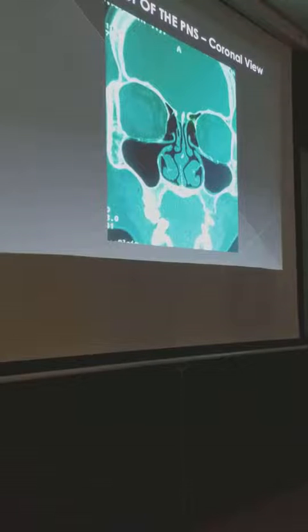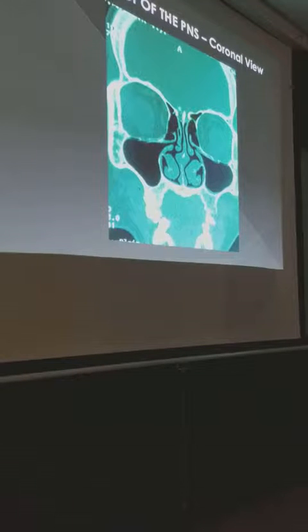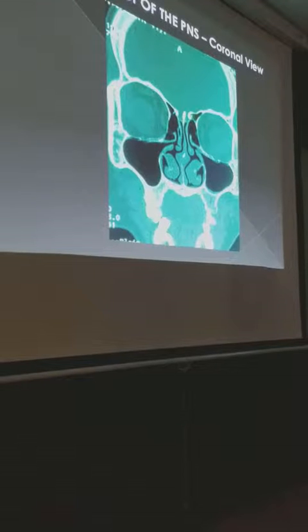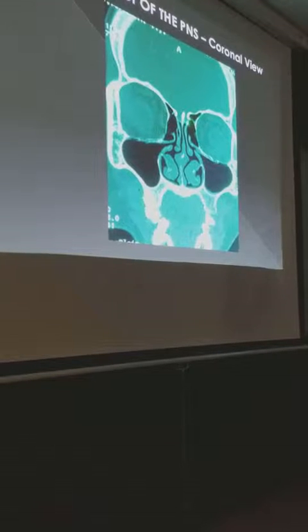Because it is perforated or penetrated by the orbitocranial canal. Okay? So, if this is 0.5 millimeters in thickness and the lateral lamella is 0.2 millimeters and this is 0.5, okay? That area where the orbitocranial canal enters the skull base, at that junction, is only about 0.05.